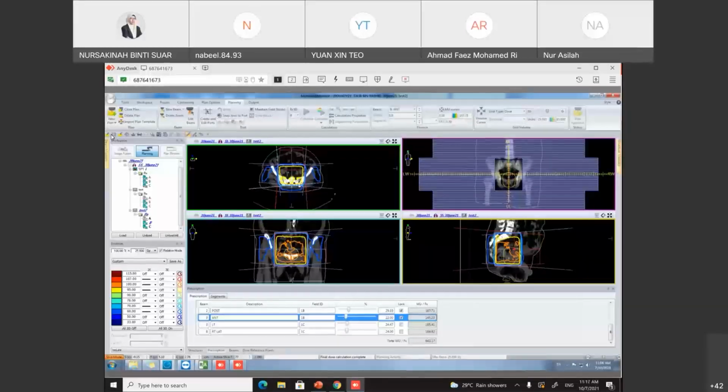Yes. But of course, when your doctor or your senior physicist asks, why this plan? Some centers don't really mix the photon energies like us, so they will definitely ask why you put the lateral beam at 10 MV when 6 MV already achieved the doctor's criteria.